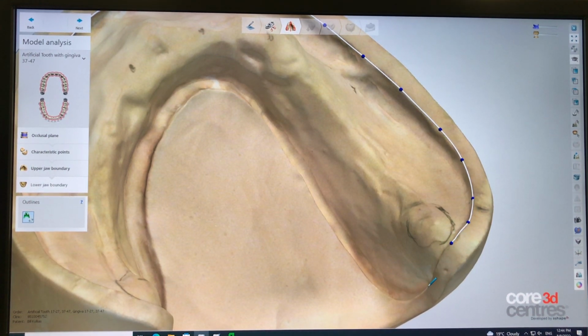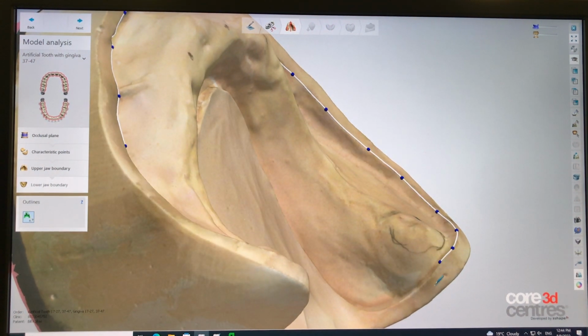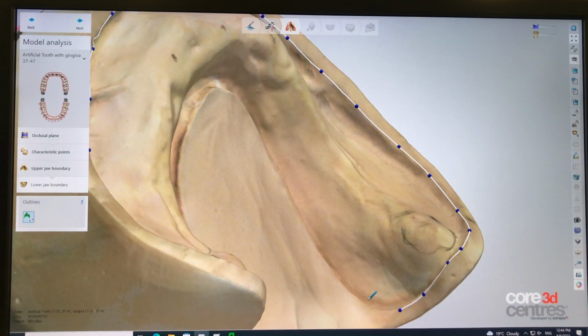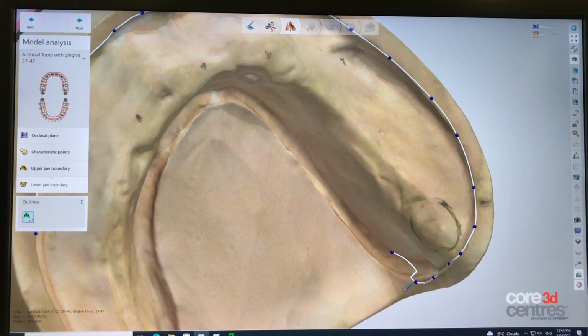And then right here in the retromylohyoid area, I'm going to rotate it to get a nice view to ensure that I hit the ledge of the land area. Because if you don't get the right view, you're going to do this, and then you did that. You see that? That's not correct. So we're going to hover over the spline, the last portion of the section, right click, undo, and I'm going to go over here. That's a whole lot better now.